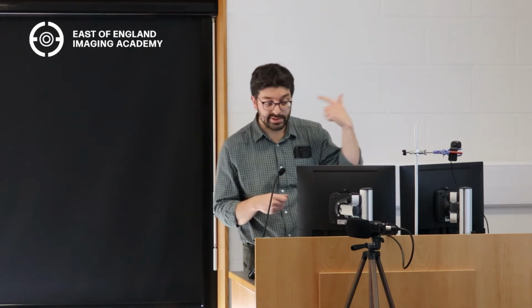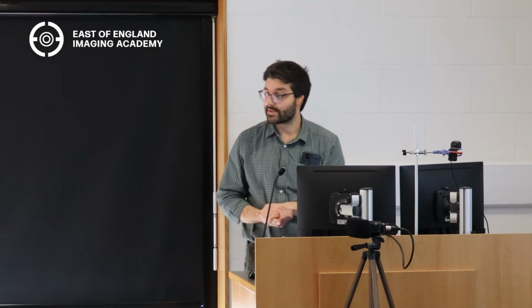I won't go into the appearances of endometriomas because they don't usually look like this, but it's a good thought, because it shows that you're thinking about this particular patient, given their age and everything else. What other things could it be? This turned out to be a pseudopapillary tumor of the pancreas, interestingly enough. But I wanted to show you that case just to show you the kind of thought processes that you go through as a radiologist when you're dealing with a case like that, and you're like, oh God, what's going on?